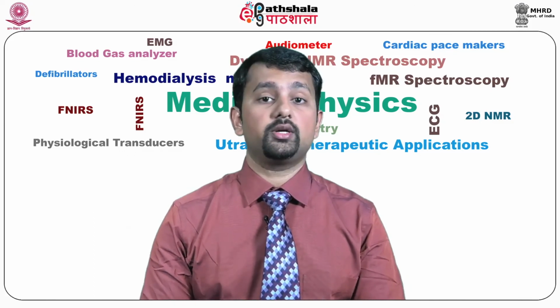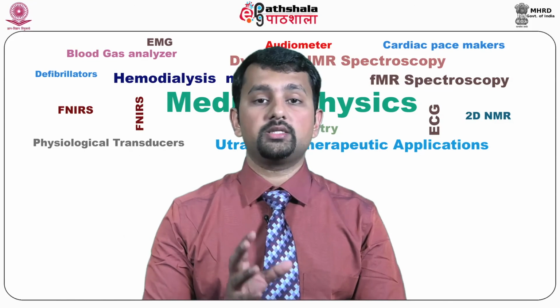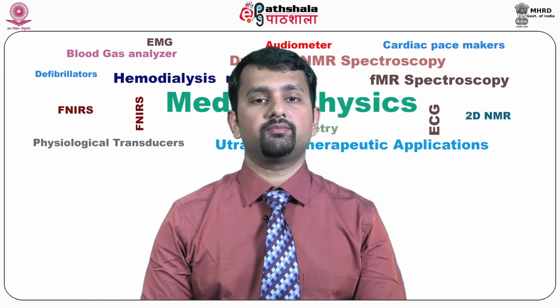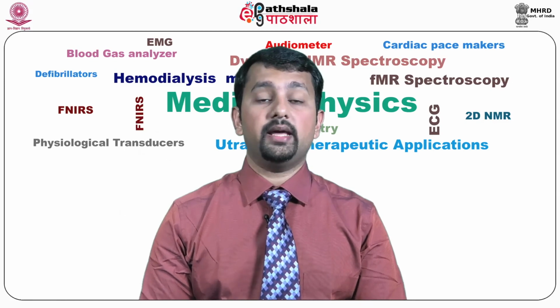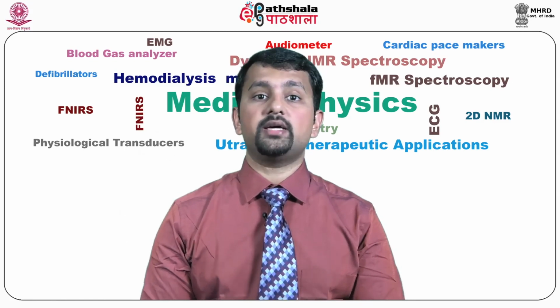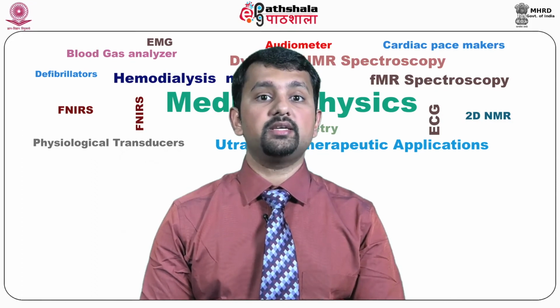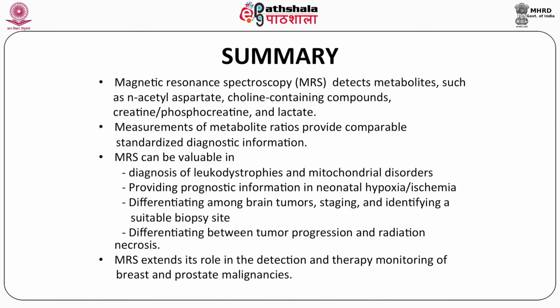This is very crucial, and a considerable amount of shimming is required before we start these studies. Artifacts can arise from dental implants, proximity to sinuses, inclusion of bone in the voxel and lipid signals arising from bone marrow.